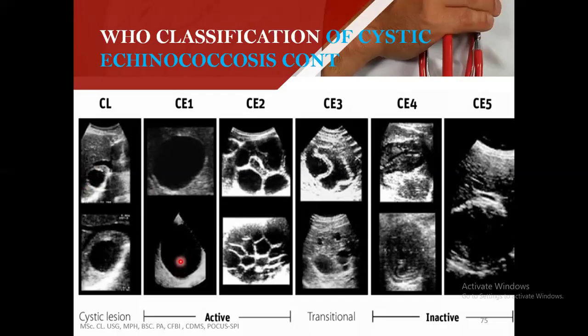Yes. This image was captured likely from endoscopic ultrasound. Yes, that one, the probe is passed through your mouth, through the esophagus into the stomach, and it gets closer to the liver, and it's able to view everything clearly. It's not the normal probe that we use. No, we have an endoscopic probe.